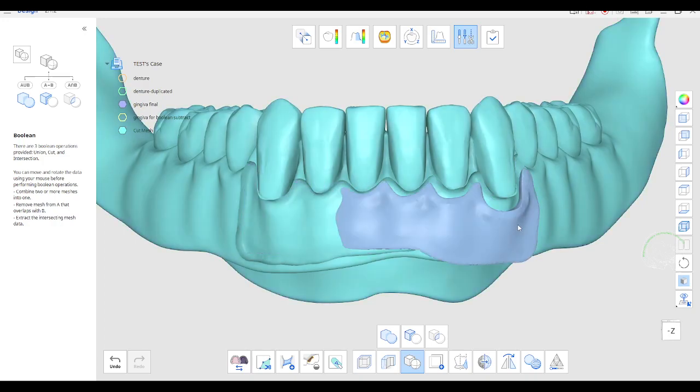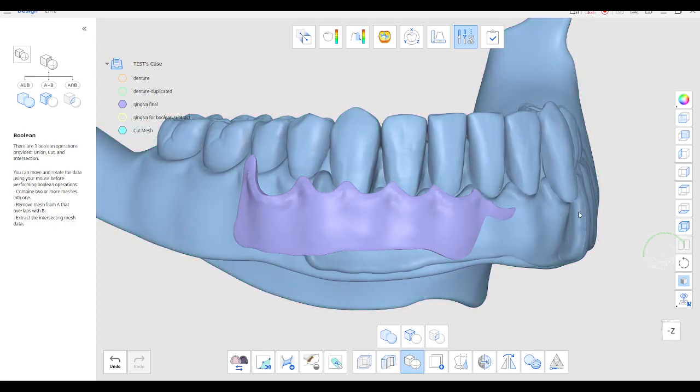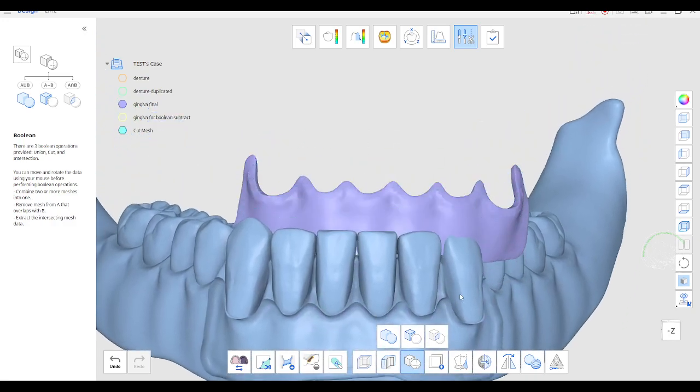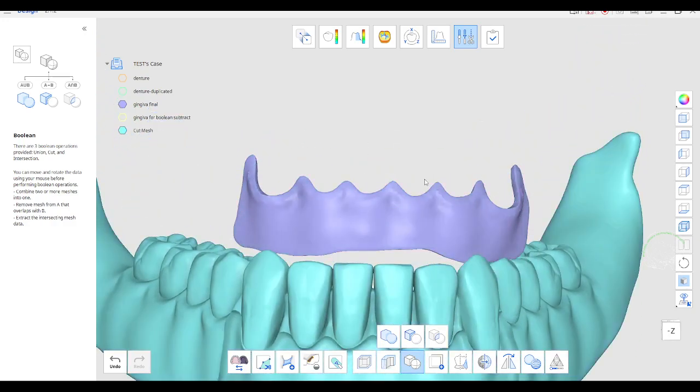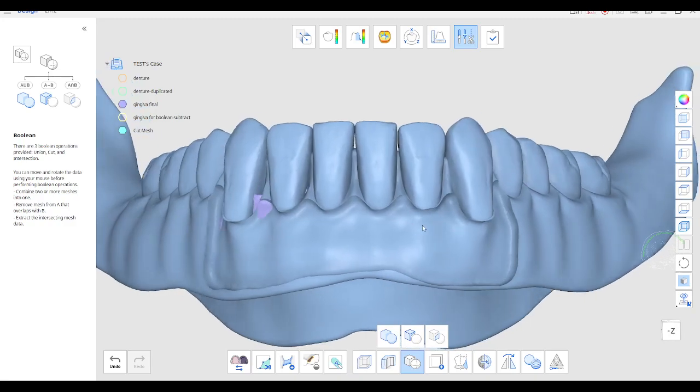Now, if you are doing a whole denture, for example, where you want to do the molars and the interior and everything else, be careful of that, because when you print this, it's always going to be rounded. So you're going to have a hard time fitting it at that angle. So what I would do is create this and then take it into Mesh Mixer and cut it into 3 even sections and print them all separately and join them together for printing. So that's pretty much what I do for this kind of thing. That's kind of my whole protocol.